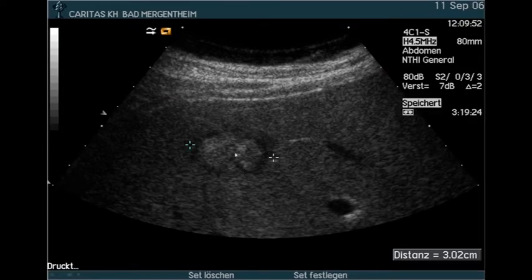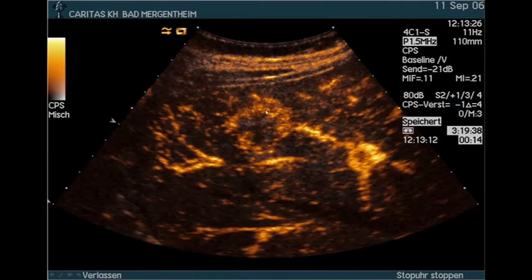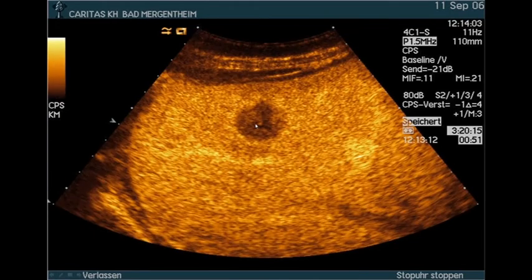A lesion in the liver, shown here, arterial enhancement, rim enhancement, hyperenhancement during the arterial phase, and a few seconds later, hypoenhancement. In this case, the biopsy and histology will prove metastasis, and we have to judge according to oncological principles if that patient will be treated by transplantation, surgery, local ablative features, or chemotherapy and additional therapeutic options.